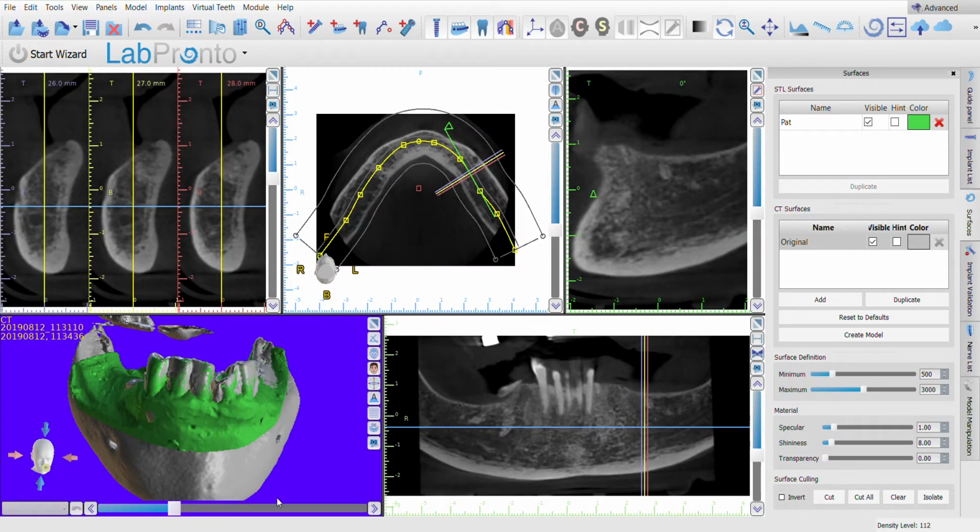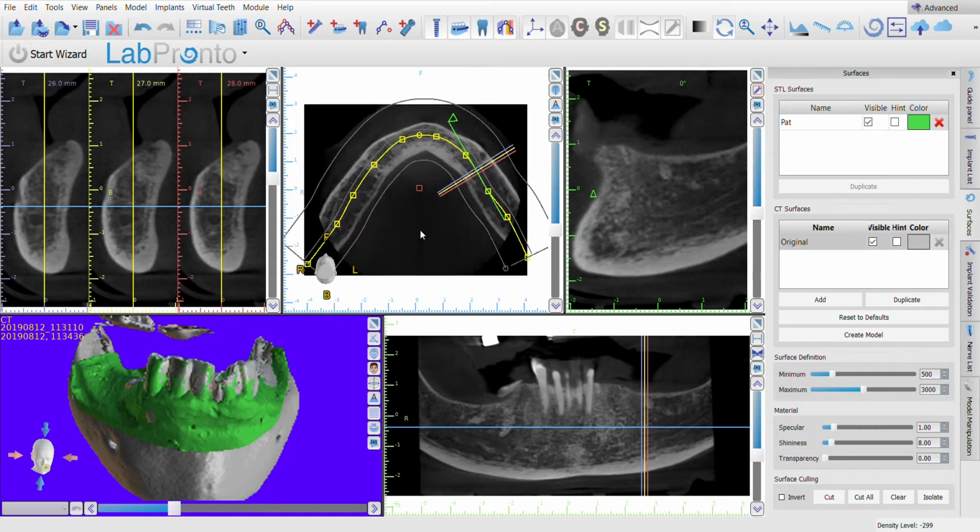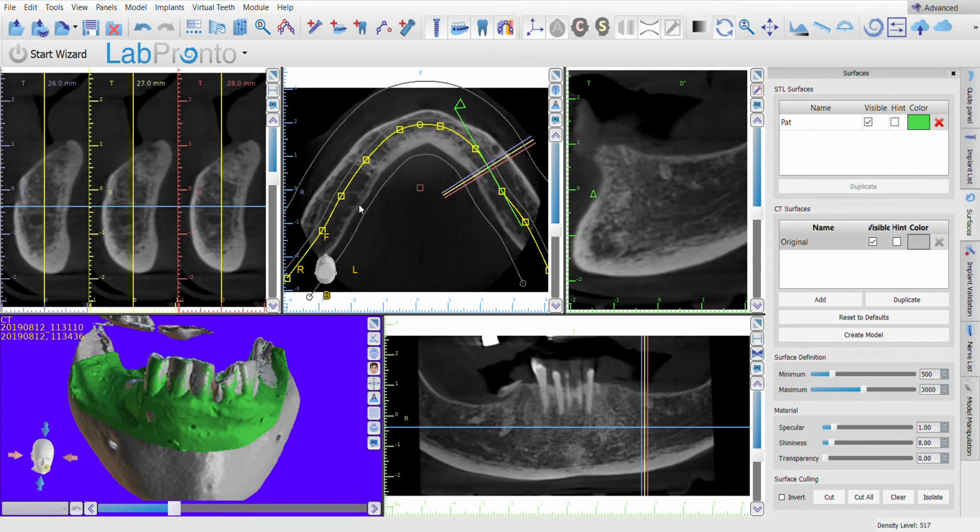Okay, so now that you have mapped your mandible properly, if this CBCT program has a maxilla as well as a mandible, I would suggest you first do whatever you need to do in one arch by mapping it properly for that particular arch.